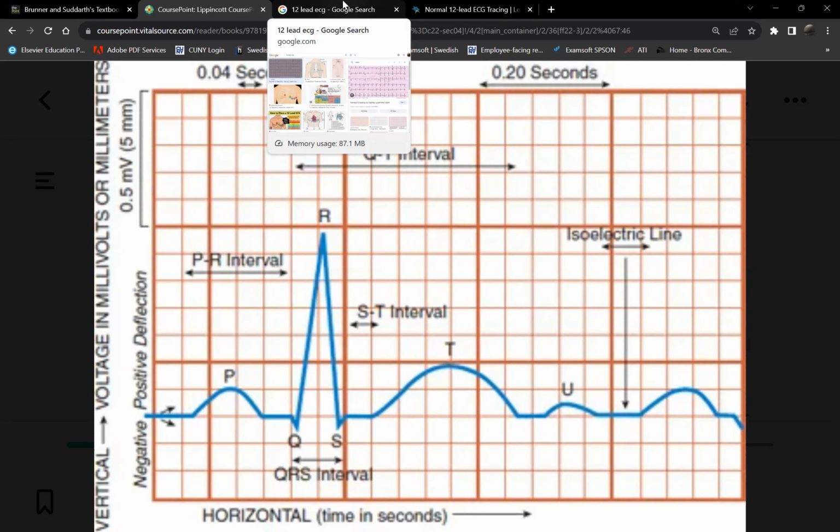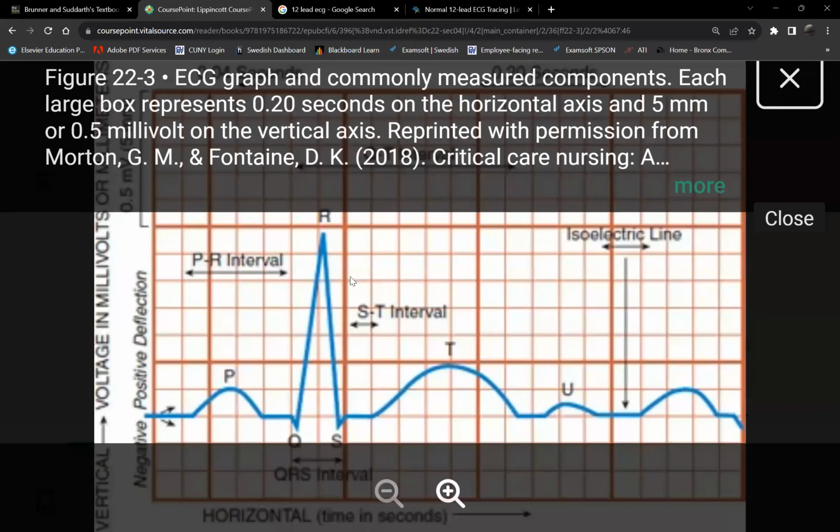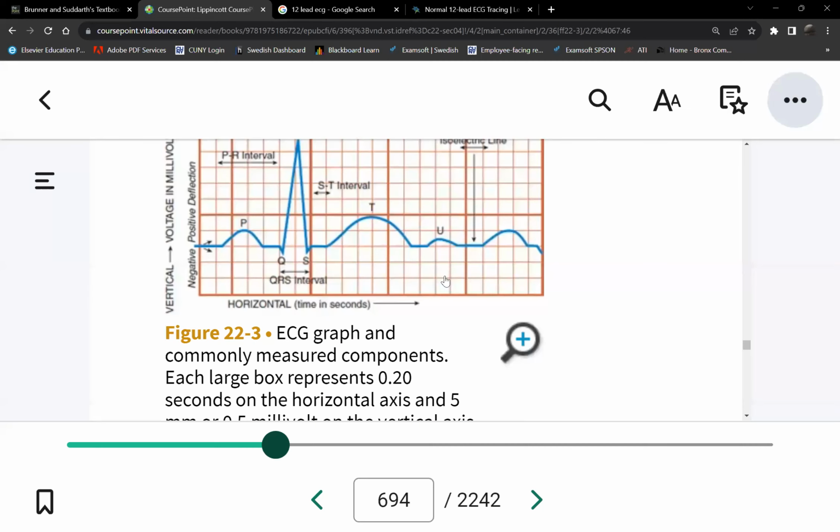So therefore, we can say that atrial contraction lasted how long? Less than 0.12 seconds. Okay, so it's about 0.11 seconds. You follow so far? All right, so that's the P wave. Next, let's go by the order in which things happen. So instead of looking at the QRS, let's look at the PR interval first.